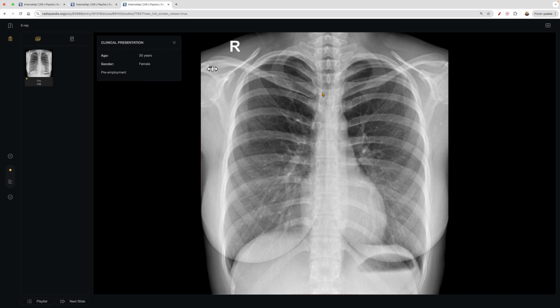And then you can appreciate here, there's a bit of a darker line, whiter line, and that is known as the paratracheal stripe. It is known as the paratracheal stripe because it's next to the lung, and so you can see this nice, beautiful boundary because there's two different densities. Two structures with the same density you can't really appreciate as well. And we'll talk about that later with the silhouette sign. And so that is pretty much the overview there. And then this is the right mainstem bronchus, left mainstem bronchus, where it diverges is known as the carina. It's spelled and looks like carina, but it's pronounced carina.